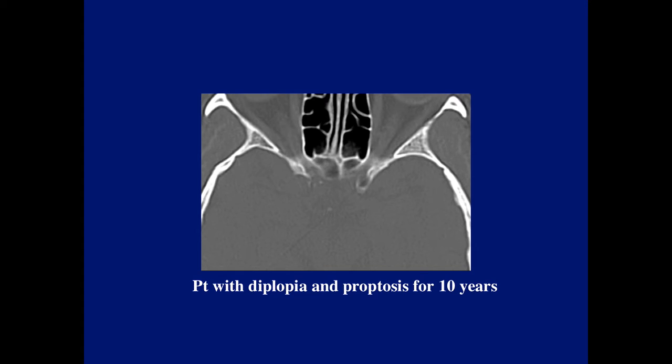Correct. As both Ben and Dan mentioned, there's erosion of the right anterior clinoid.